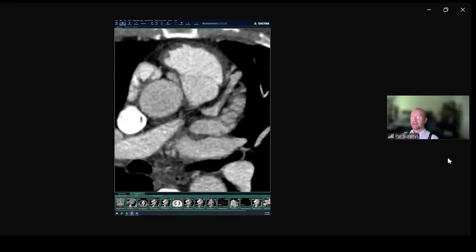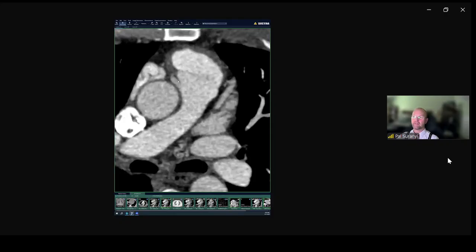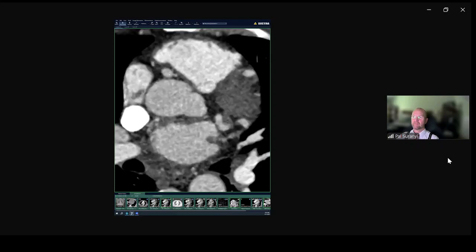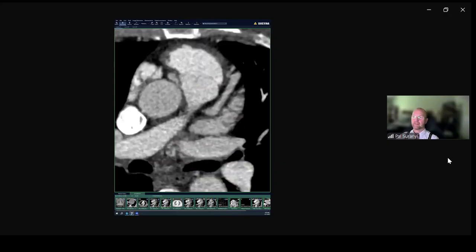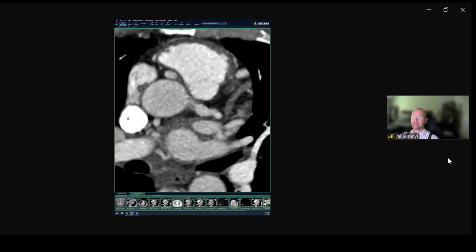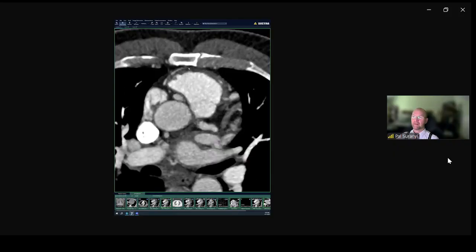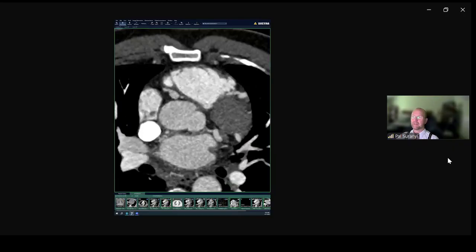So this is certainly very, very abnormal, right? We have a coronary artery arising from the main pulmonary artery that goes a little bit interarterial, but mostly, as Dr. Amal pointed out, mostly it's going to be subpulmonic. Does have these branches. This would be a conus branch where it's close to the sternum, so that's probably something that you could mention as well.